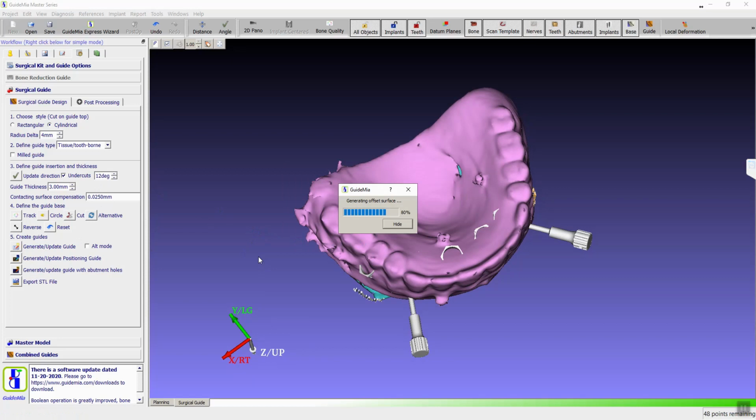That's pretty sweet. So all those guides will exist. We can turn them on or turn them off in that selection window. Sorry, ladies, that was a detour, but I thought it might be interesting, especially if we want to have a handful of guides to bring to Dr. Manlily. Absolutely.